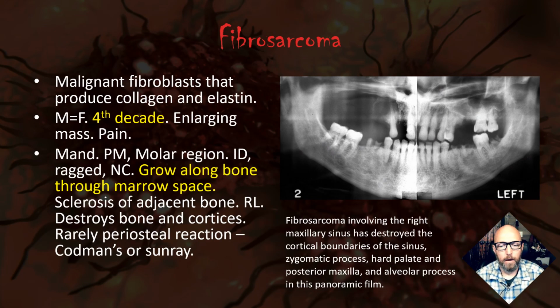All right, fibrosarcoma. If you look at this panoramic radiograph, basically, it looks really similar to what we just showed you with squamous cell carcinoma arising in the sinus. Nothing necessarily radiographically jumps out to me and says this is a fibrosarcoma and not some carcinoma that arose in the sinus. We have your ill-defined borders, just very destructive. If they had teeth here, maybe the bone's been destroyed so much that they're just falling out at this point, but you might have that tooth floating in air appearance.